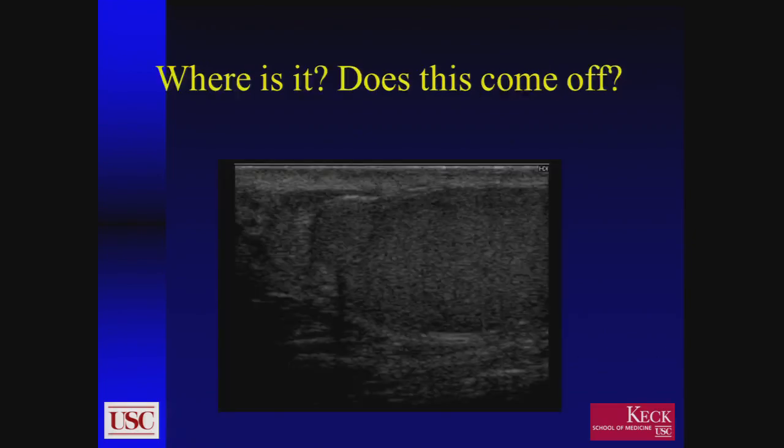Now that can be contrasted with this patient, where you see the testicle here. You can see a solid mass that is intervening between the testicle and is probably arising from within the epididymal head. Now I think most people would agree that the one thing we do with ultrasound that's very, very important in the scrotal examination is determine whether you're dealing with an intra versus extratesticular mass.